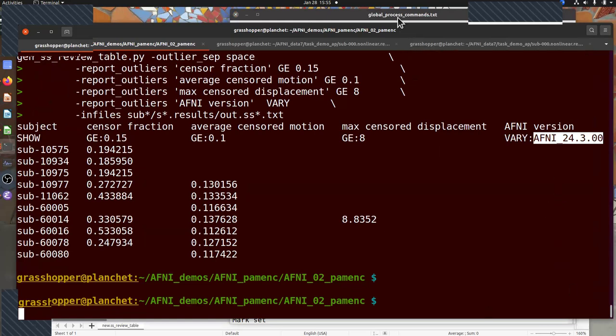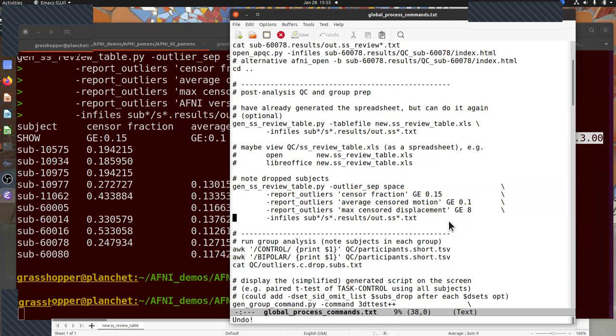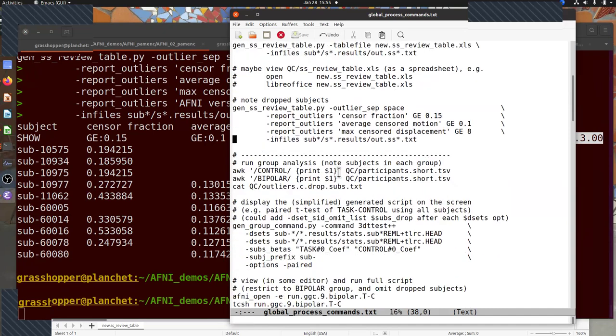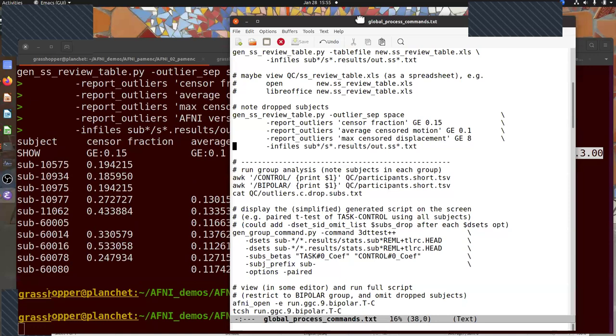So now I know. Okay, so this is very flexible, and you can use a lot of different things here. But this is a really nice thing to do for quality control and to complement, not replace, the qualitative one that we looked at.